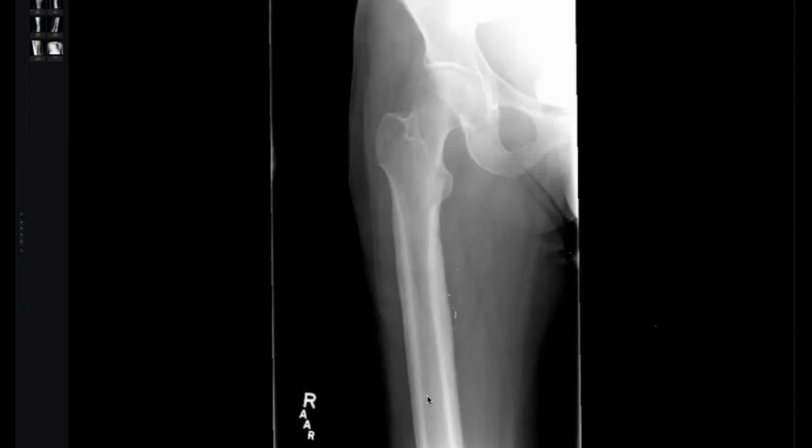Search for any differential increase or decrease in density in all the bone. Number two, the cortex or the periosteum. Sir, I have been presented with one upper limb and it was the answer. I was struggling too much, and finally it was some periosteal reaction. Yes, there is periosteal reaction.